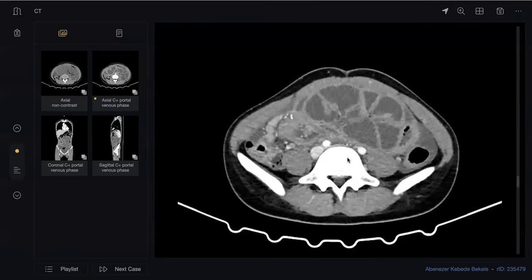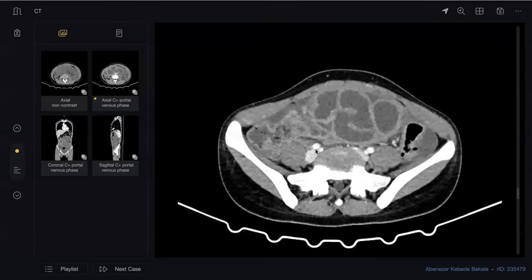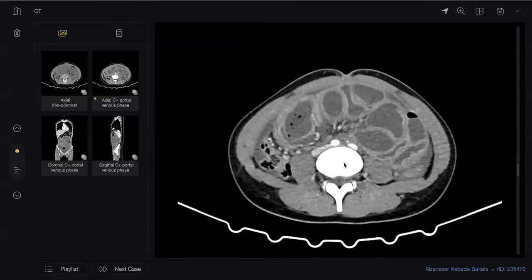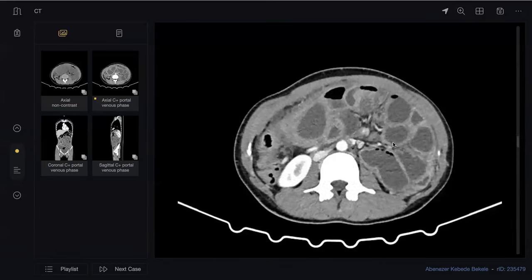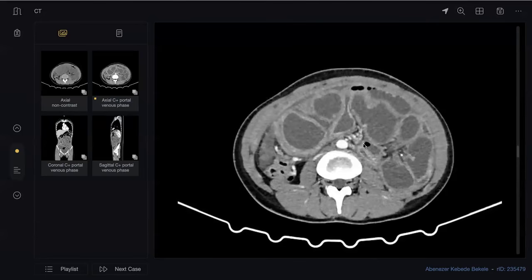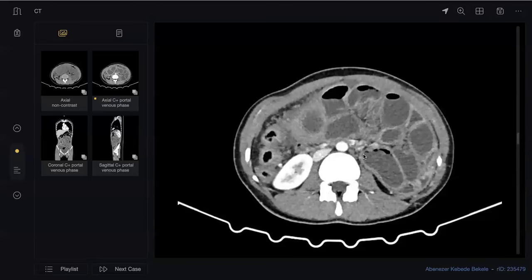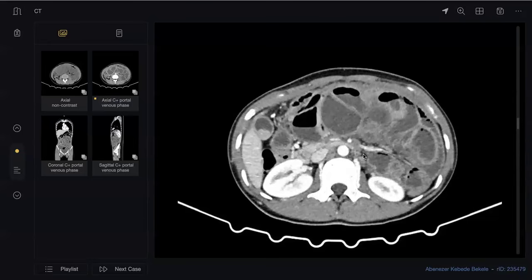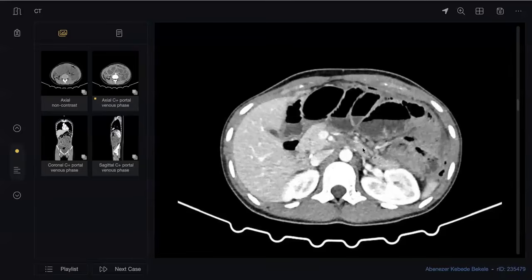So do you think this patient overall has intestinal obstruction? Yes, this patient has intestinal obstruction. What is the cause? As the bowel loops appear to be dilated and are clustered together on the left, I'm suspecting an internal hernia. Are the bowel loops thickened? Yeah, the bowel loops appear to be thickened. These could be secondary to an underlying inflammatory process or an ongoing ischemic process. These are the two differential possibilities. Do you see any signs of ongoing bowel wall ischemia?